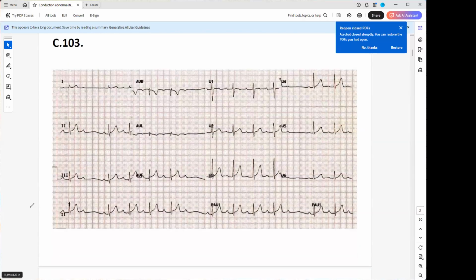So I don't know if I did it correctly, but I'll try. You never start an exam saying you are not sure whether you know or not. No way. You have to sell yourself. Okay, this is arrhythmic. Good. Go on. I calculated the heart rate from the bottom one, 50 beats per minute. Yeah, it's about 50, 60. It's okay. All right. Go on.